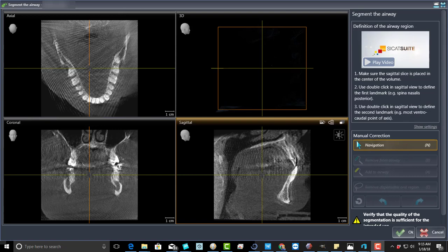And this x-ray, it looks like there was quite a bit of distortion, or it was taken wrong. I guess it's distortion from all of the metal crowns that are in her mouth, and it just kind of goes back into this area of the airway. And I'm going to show you what to do about that.